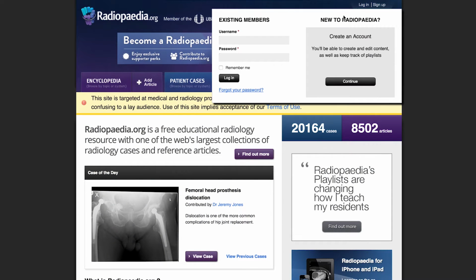Hello and welcome to this Radiopaedia tutorial. Today we'll be showing you how to upload a case to the website.